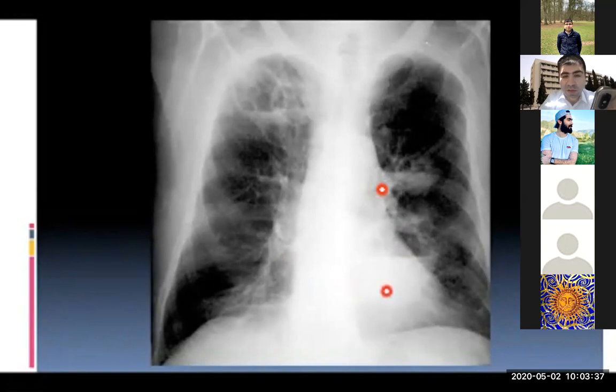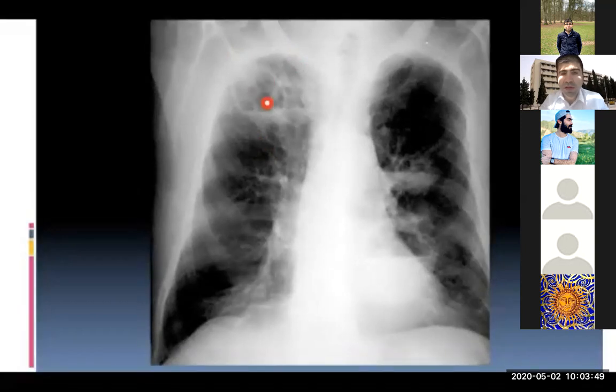This is a lesion actually, it sits here, but regardless of this, there is a round shadowing with fluid level seen in the right upper zone, but we have another lesion here, which is retrocardiac. So this is a hidden area. If you don't concentrate on the hidden area, you may miss this pathology actually.